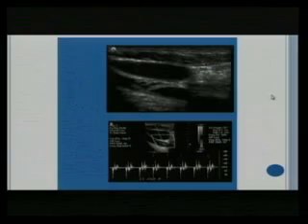The presence of early diastolic flow reversal in the ipsilateral common carotid artery, and reduced peak systolic and diastolic velocities in the ipsilateral internal carotid arteries, are all non-specific but warrant a search for a cause of increased peripheral vascular resistance. So that's what I wanted to bring to your attention: this is a unilateral, bizarre waveform, and no amount of plaque can explain it. It's just an unexplainable phenomenon, like it was with that patient. There's no plaque, it's a younger patient, and a very bizarre, non-specific waveform.